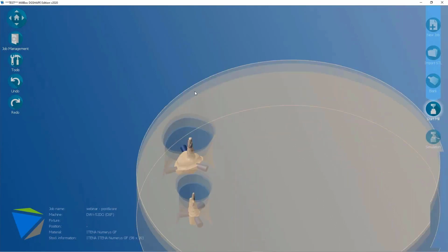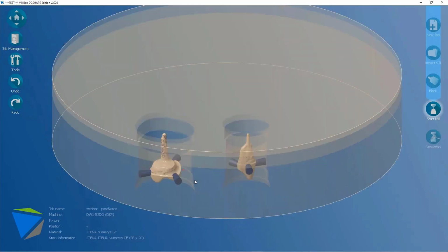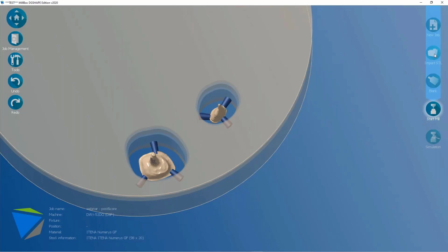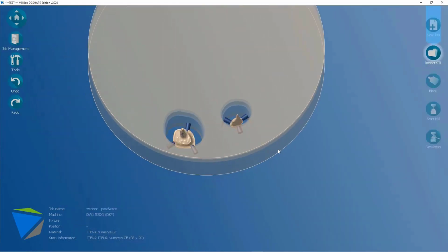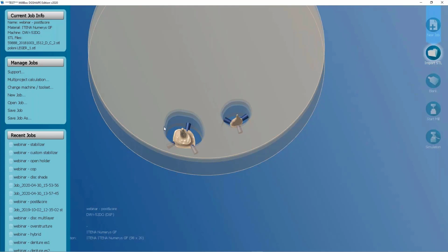We added it. Of course, it was already possible to make it thanks to our standard strategies, but now we improved this kind of item management by adding a specific object to be milled. Okay, thanks. So the strategy mills by using a particular machine for that. Or, for example, we added other kinds, but it's very easy because it's already inside. No need for any particular thing. Just load the item, just select it, load it, and mill.